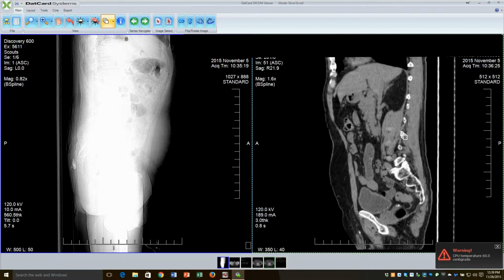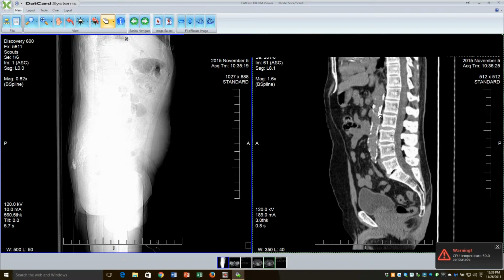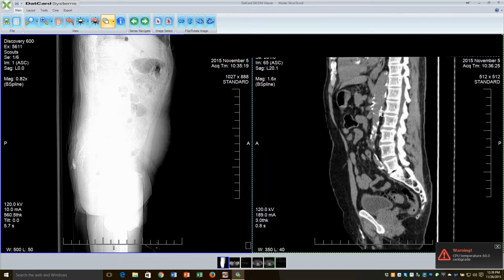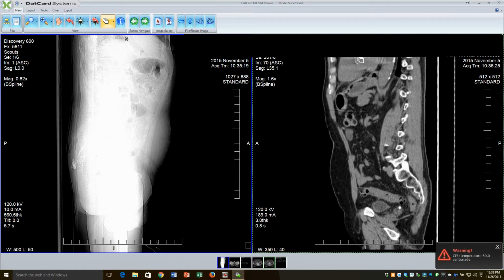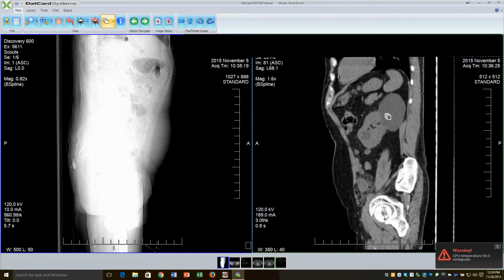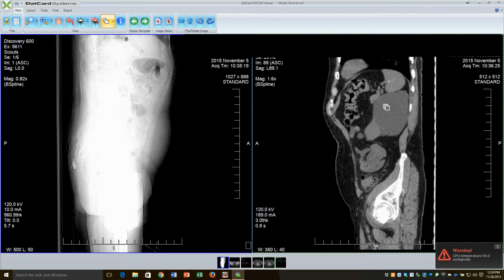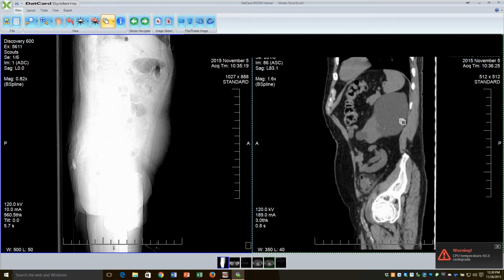So here again is aorta, lots of arteriosclerotic hardening of the arteries, arteriosclerotic disease, lots of disease in the heart, lots of disease in the coronary vessels. Giant cyst on that left kidney, and you can see how big it is. Even has a smaller cyst here at the apex of the left kidney.